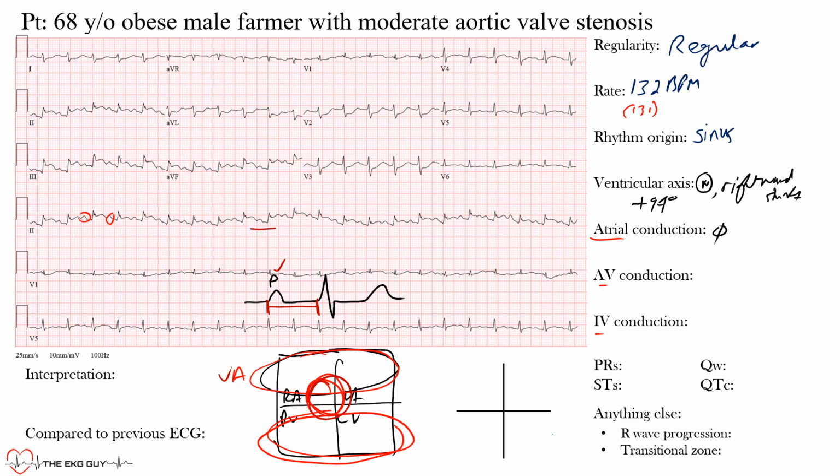If you look here, you want to find a P wave, so notice that the QRS complex sits there, and the P wave just about there. That one big box is 200 milliseconds, which is kind of the upper limit of normal for an adult patient. This was actually measured by the machine at 206 milliseconds. In that case, we would call this delayed conduction through the AV node. Because you see that consistently throughout, this is representative of a first-degree AV block. No dropped beats, so we don't have to mention anything there, but hopefully that makes sense. So this is a first-degree AV block.